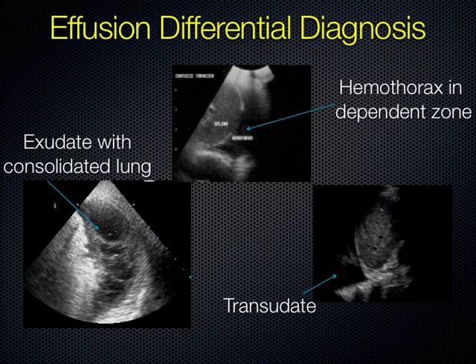Notice on that bottom right image of the transudate, you can see the spine shadow behind that fluid. You see the spine sign? Okay.